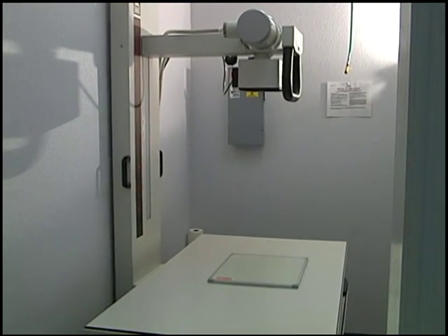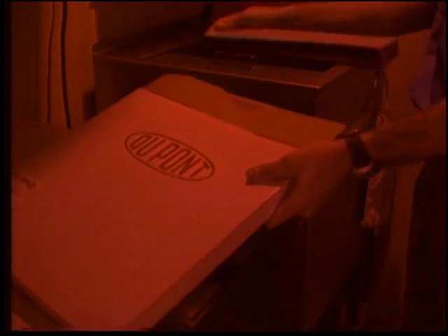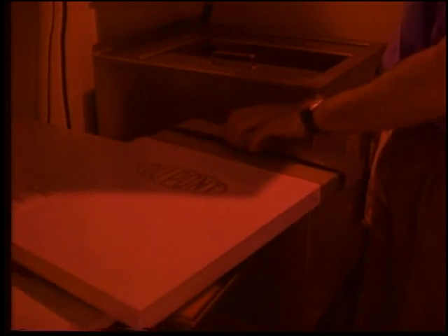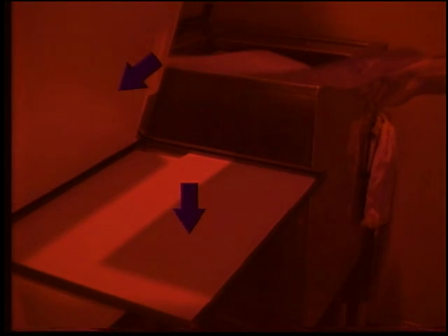The X-ray film is enclosed in a light-proof case called an X-ray cassette. This protects the film from the visible room light. Most contemporary cassettes are lined with special intensifying screens. These screens are impregnated with chemicals that fluoresce when struck by X-rays. This allows an image to be made using much lower X-ray exposure energy. Screens, especially the high-speed and rare earth screens, will enhance the exposure as much as 20 times.